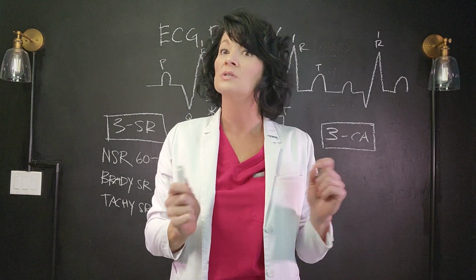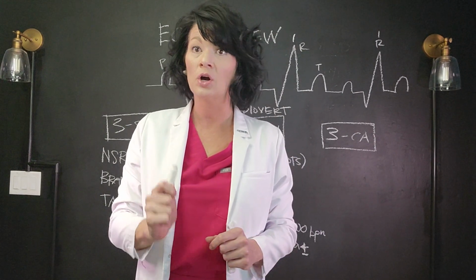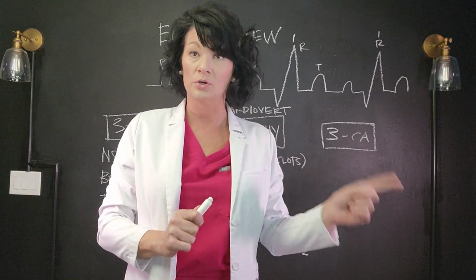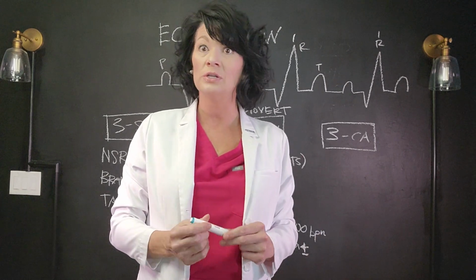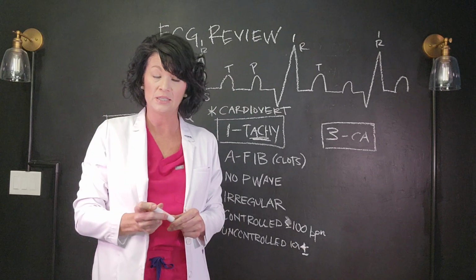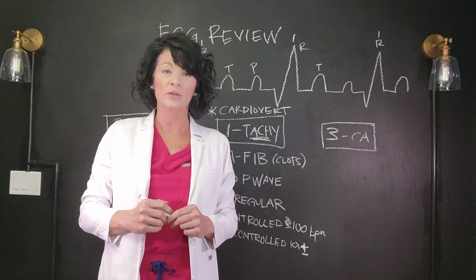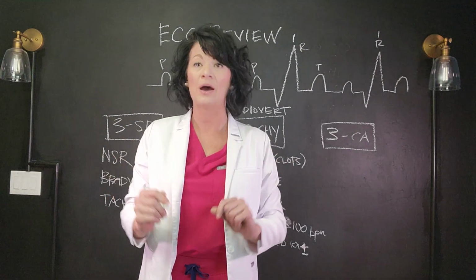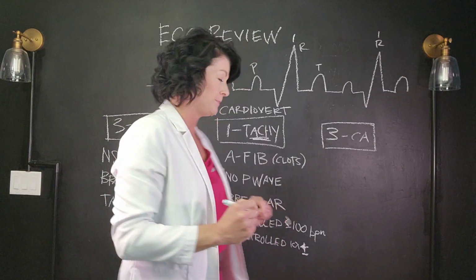However, PEA, if you decide to go get either Advanced Cardiac Life Support Certified or Pediatric Advanced Life Support Certified, in those cases, you will need to know what PEA looks like in the details, but it can be any single rhythm except for the 3 I'm going to talk about that present without a pulse. That is considered PEA, okay?